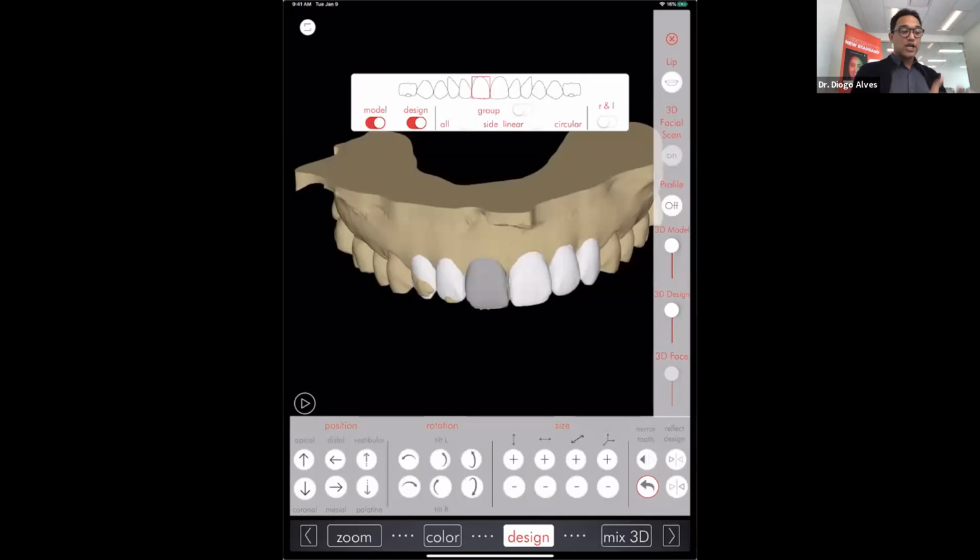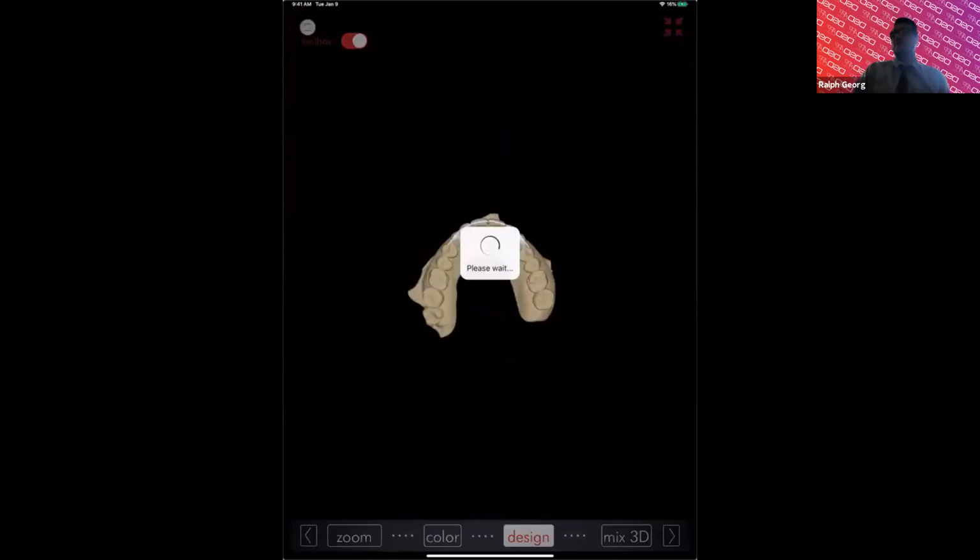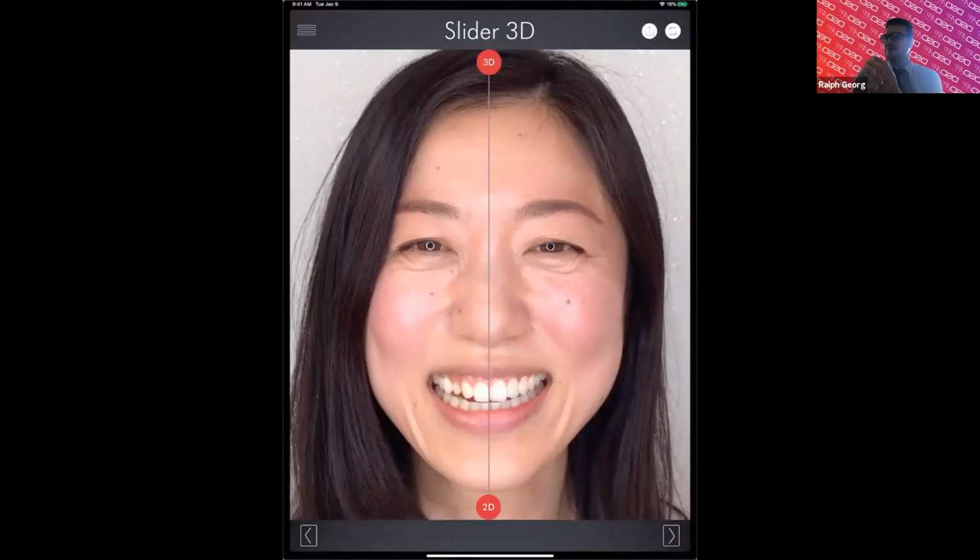And the greatest thing is that you will always have all the patient's information here. You have all of those files, all of those pictures, all of those videos, all of these other documents. So you are ensuring yourself that you can change here or there. You will know, because you have this digital patient right here, right in your hands. And I think that's what's great too. Even if you're not in the office, if you're away on vacation or somewhere else, you can pull it right up and have access to all of it. And I think that's very valuable.